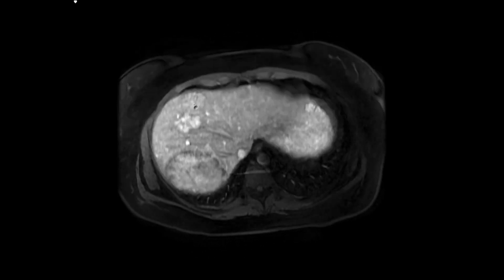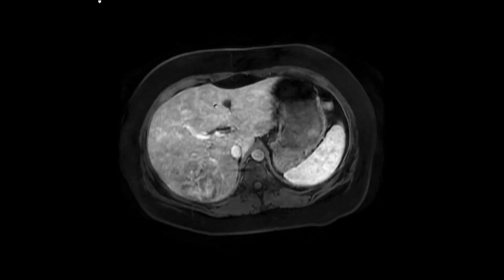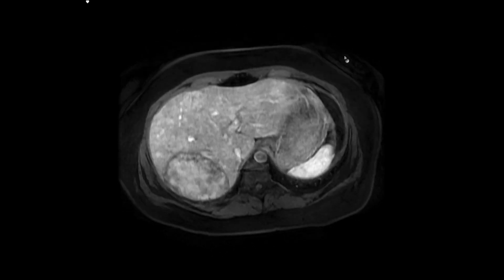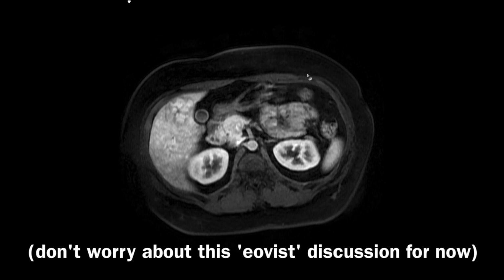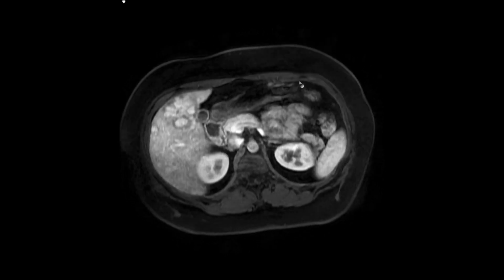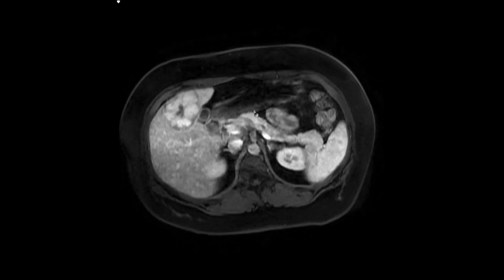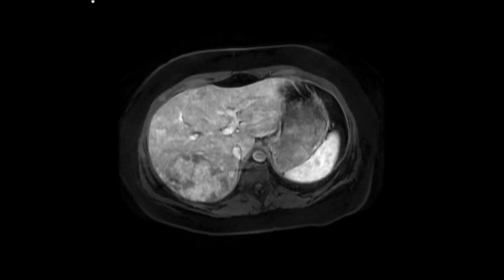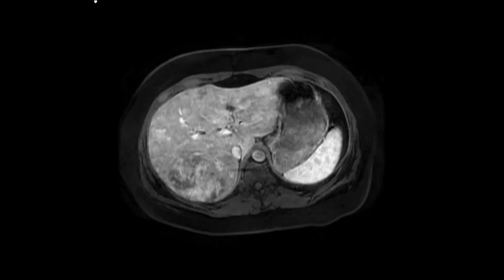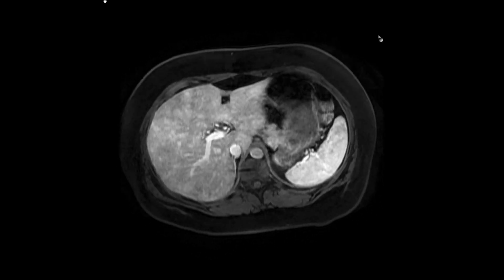And there are multiple other lesions that are also arterial enhancing. Actually, I should mention that this is an EOVIST study, so we didn't give normal gadolinium contrast or purely extracellular gadolinium contrast that we're used to using in MRI. EOVIST or Primovist is a 50% extracellular contrast agent and 50% hepatobiliary agent that is excreted in the hepatobiliary system.